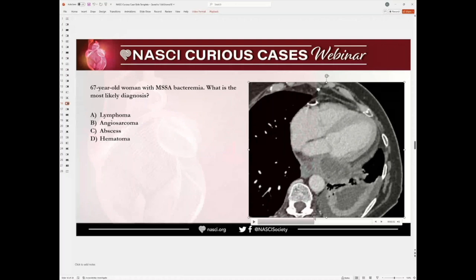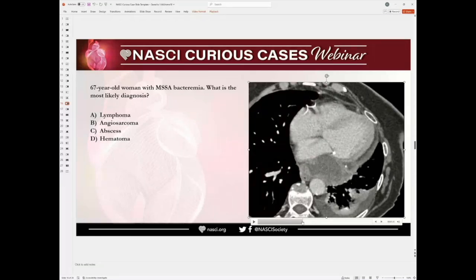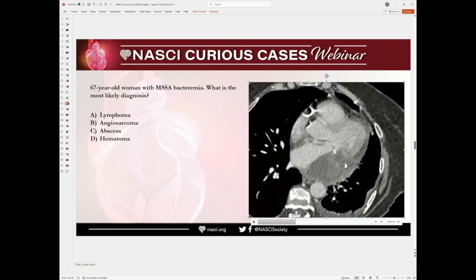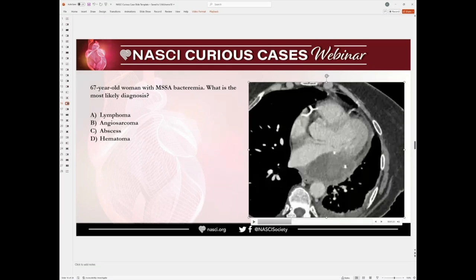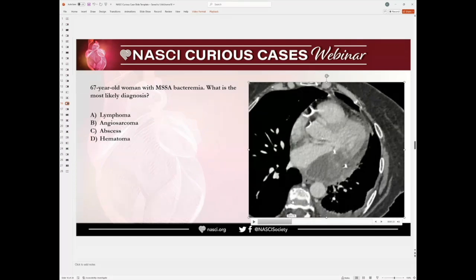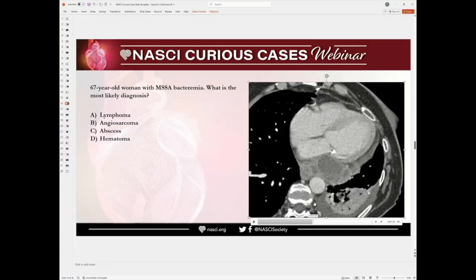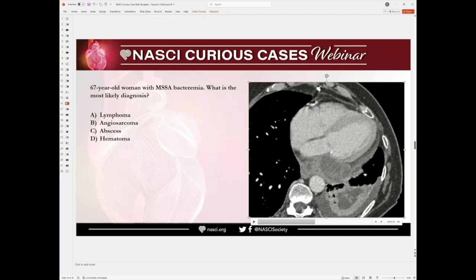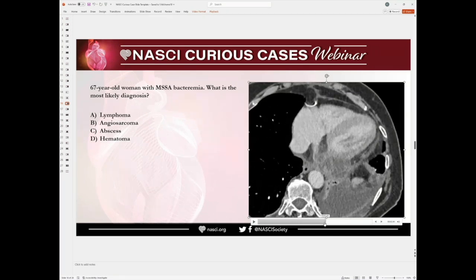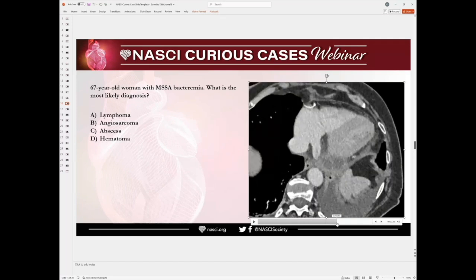When I saw the case, we also had an outside study, so I knew they were asking about abscess, and I knew this was going to be an abscess. I was also very surprised by how aggressive it is, especially the circumflex. If you look at that circumflex pseudoaneurysm, I personally hadn't seen infection eating through like this. We saw all sorts of endocarditis, perivalvular abscess. This looks like a perivalvular abscess normally, you can see the wall enhancement. It is just aggressive. It is even trying to compress the coronary sinus, causing some thrombus over there. So to me, it was interesting.